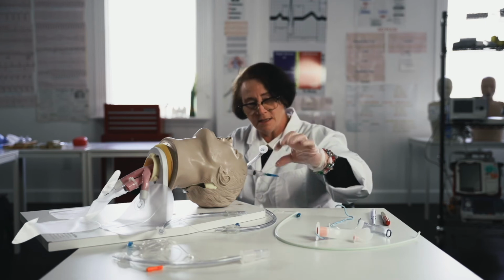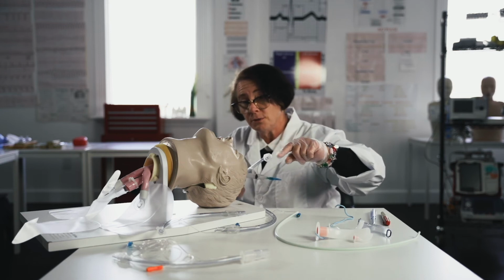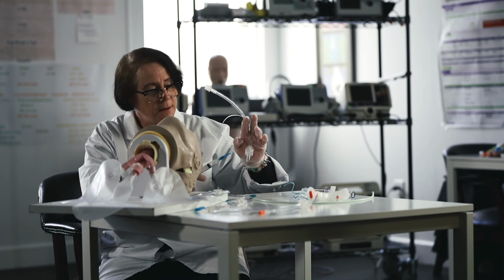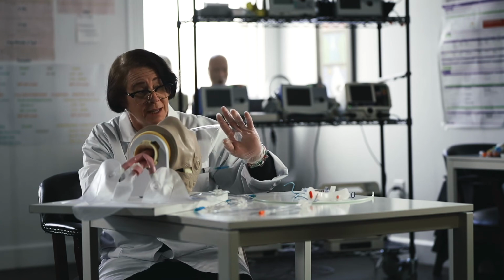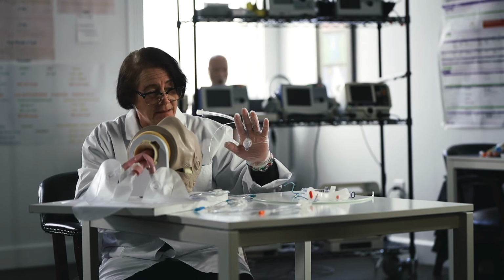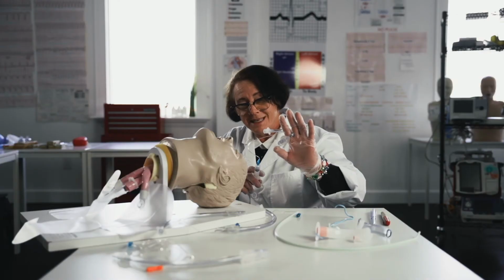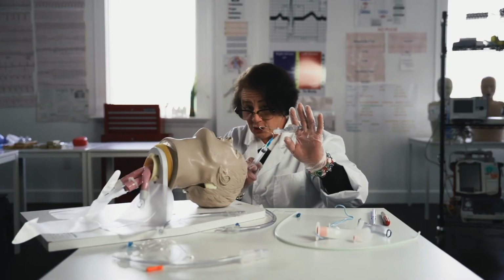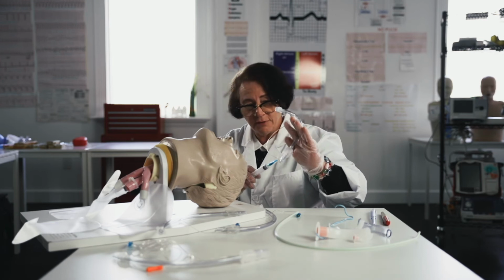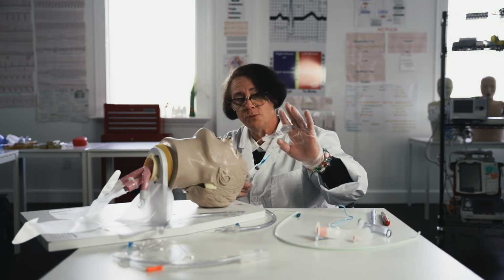What this balloon does is prevent air and oxygen from escaping around the tube, so they only breathe through the tube. The cuff or the balloon sits below the vocal cords. So if the balloon is not adequately inflated, the patient will make sound, and you're not supposed to make sound. I know that's a balloon problem. I would probably add 1 cc of air, call respiratory therapy, and they'll check the pressure in the balloon. But that's how you know your balloon is not adequately inflated. That's the balloon's job, to prevent air and oxygen from escaping around the tube so they only breathe what's through the tube.